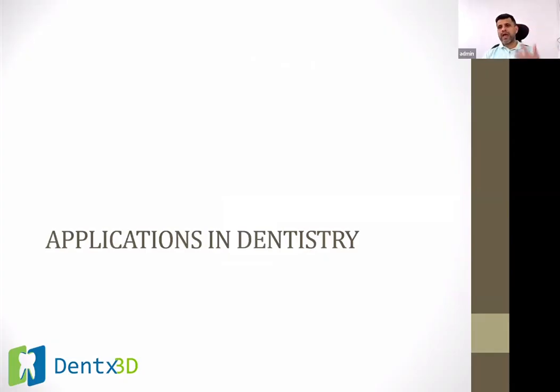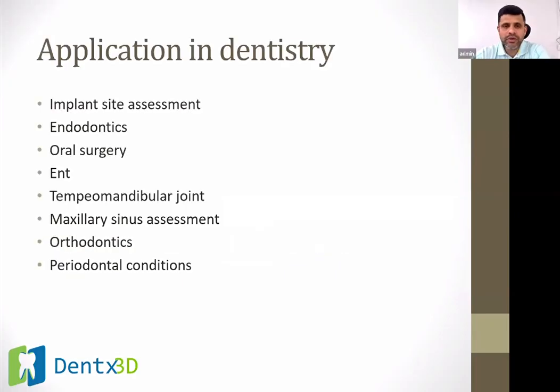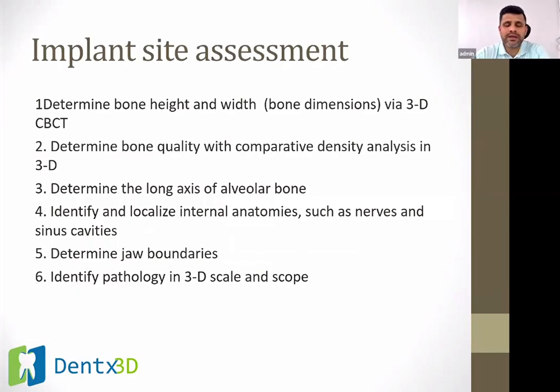So after that, we will see the applications. The CBCT is applicable in all the fields of dentistry. And we will see pertaining to implant planning. So in implant planning, we can determine the bone height and bone width. We can determine the quality of bone.